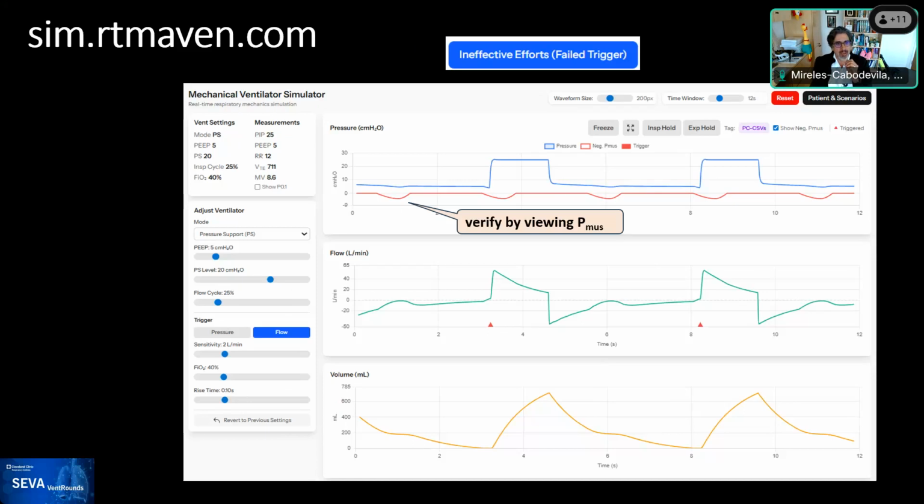That's a key item of your visual acuity to learn how to do that. So now you can add on the PMUS and see how that changes the waveforms, so that you can do a contrast and see if your eyes were looking at the best one. So it's a way of practicing yourself with the truth on what's there.